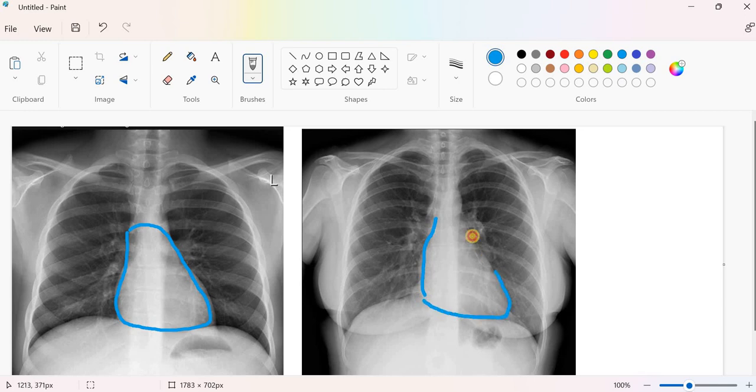But if you are going to talk about the percentage of the heart, which percentage is looking right and which percentage is looking left, around the midline, you will find nearly 1/3 of the heart is located to the right and 2/3 are located to the left. And here I'm talking about the posterior anterior view chest x-ray in a normal patient. So this is regarding the heart. It is appearing from light gray to white. And of course, the brightness is increased here because of the overlap between the heart and the vertebrae.